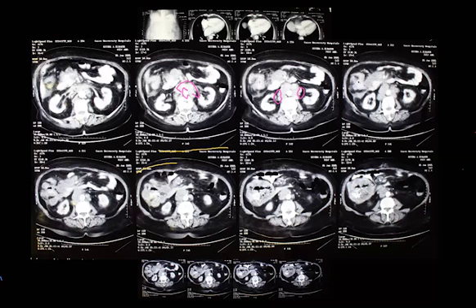Okay, but they're the ureters. I would suggest they're the ureters. I think so. They're the ureters, but I may be mistaken.